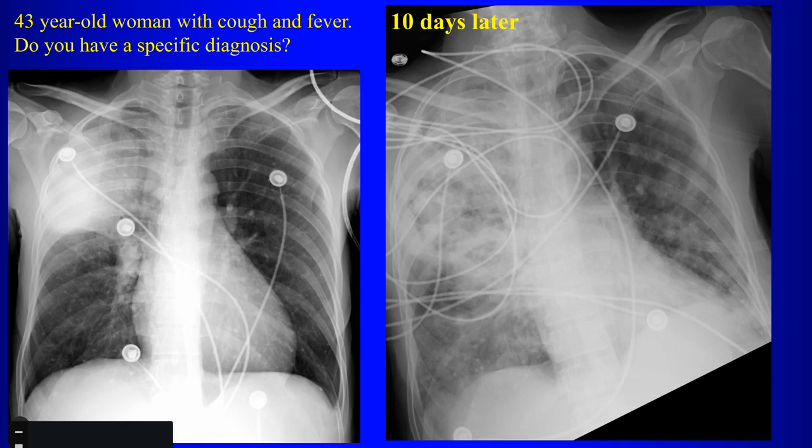What happened to the size of the right upper lobe? It increased. It got bigger. Maybe empyema, is that empyema? No. Why not? Because there's no fluid level. Empyema is infection where? Pleural space. This infection is where? In the lung parenchyma. So we're not going to say empyema.